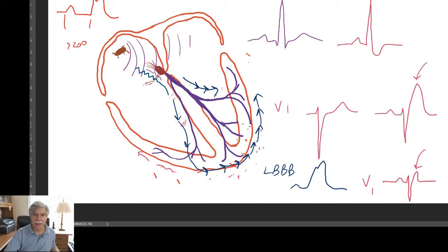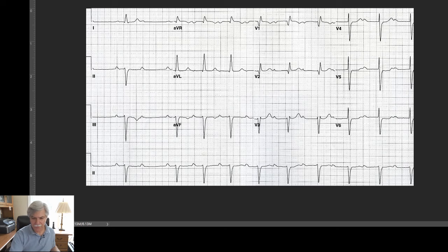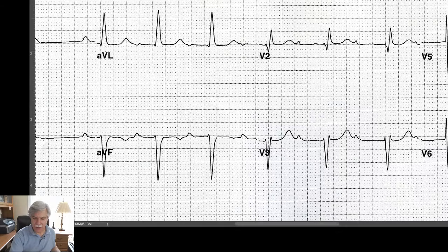Now, just to kind of throw a monkey wrench into this whole thing, I just want to show you one last cardiogram. Oh, I think I didn't open it, but let me find that file because it was really cool. Let me see. I'm sorry for the delay. Here it is. Okay, so I don't know, that's too big.